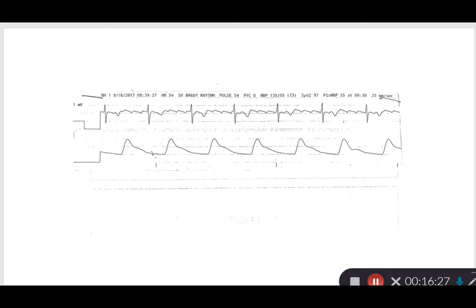All right, now we're moving on into atrial. So I got my heart rate here, 54 beats per minute. So a little slow. Looking at this rhythm right away, I can tell that I have those sawtooth type atrial waves. So this is going to be a flutter. I have these flutter waves here. So we can see the different humps leading into that QRS complex.